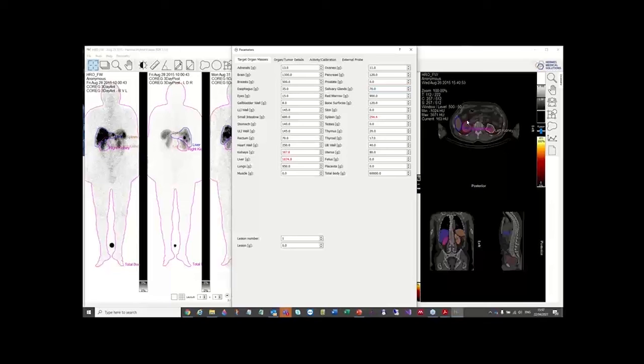Sorry, that wasn't clear. You would have to build these for yourselves, as Lara was showing, either slice by slice or with the interpolation tool. But from those regions, we can take the masses here. So just take the volume of the region, multiply it by 1 gram per centimeter cubed to get the mass. And then the target organ can be scaled by this because that is crucial to the S-value calculation. It makes a lot of difference.